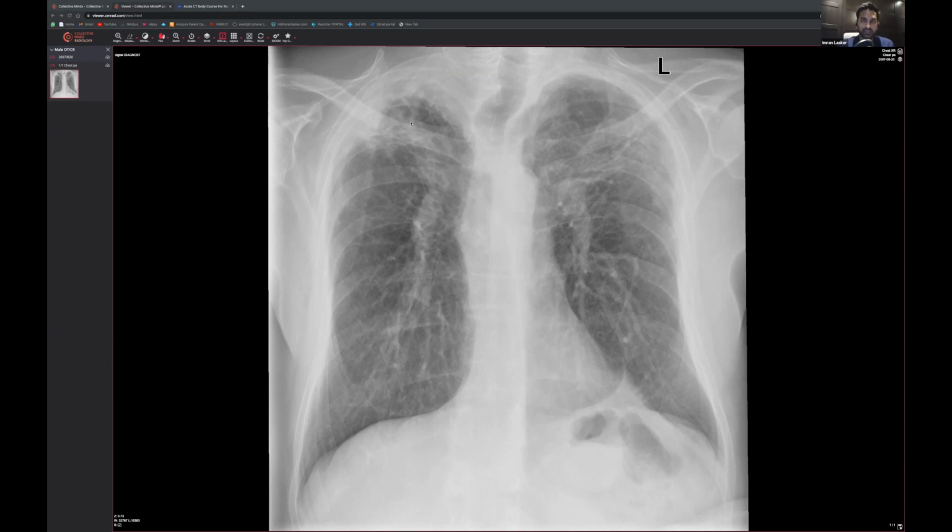Now, when it comes to TB and sarcoidosis, one of the things to also look for are lymph nodes, because mainly with sarcoidosis, but it can happen with TB, you can get calcifications of the lymph nodes. If you're looking in these areas, in the paramediastinal areas over here, and you've got calcified lymph nodes, then you'd be saying something like, I think this could be sarcoidosis. If you've got what looks like a bit of a cavity, which this arguably could be, then you could say this could be tuberculosis, correlation with clinical history. And yes, on this particular occasion, I think you can comment on the trachea, because you can see, yes, fine, fair enough.